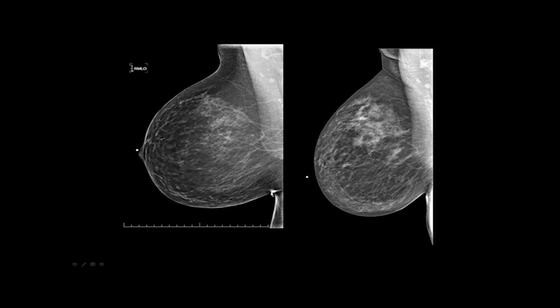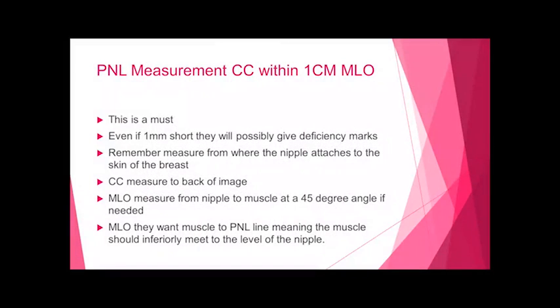This is a very acceptable image for accreditation. There's a tiny little fold here in the IMF, but there's just one thing you really can comment on, and that's not even hardly there. So do you see the difference in positioning and what you want to turn in for the accreditation body to be able to state your facility does beautiful, great work?